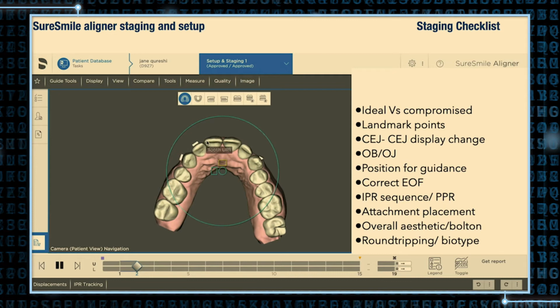So this is just showing in steps. It can be shown in a more smooth animated sequence if you want to on the software, but this way I'm pretty certain that I'm happy with the final outcome. And in the next couple of slides I'm going to show you how I specify individual requirements as well.